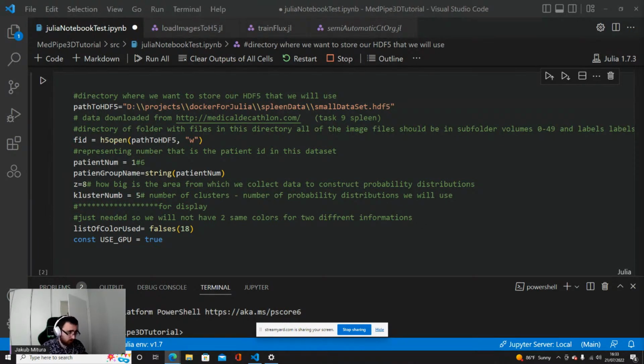I will get into in a moment how to do it exactly. We'll spend some time with it. You can load the data in arrays and do basically anything that you want. You can save them in the HDF5 format or not. If you want, you can save it in some other format.